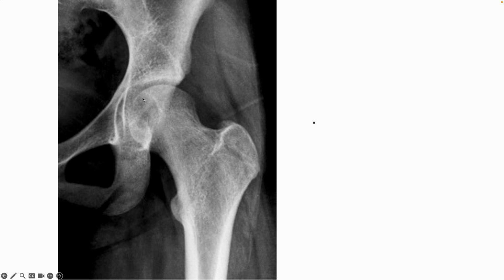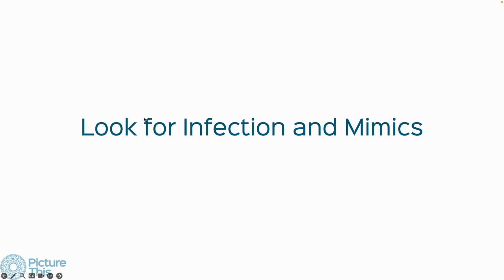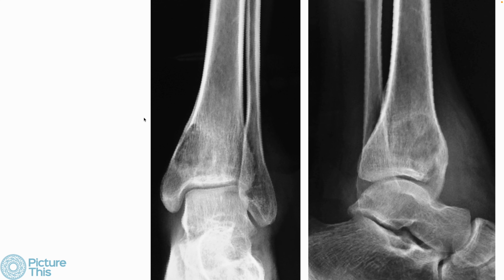Here is an osteolytic lesion. It's epiphyseal with a sclerotic rim. So anyway, you know this is likely to be a chondroblastoma from location, but it also has this typical appearance of marked marrow edema, so that looks aggressive on the MR, looks benign on the X-ray, and that's your classic chondroblastoma.